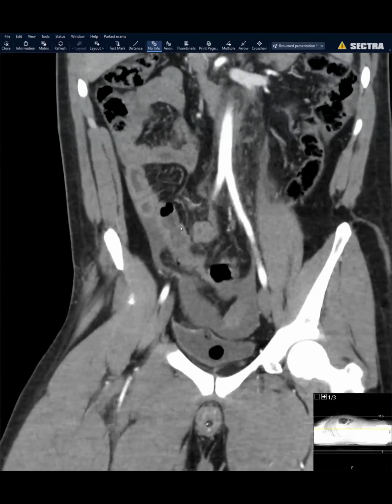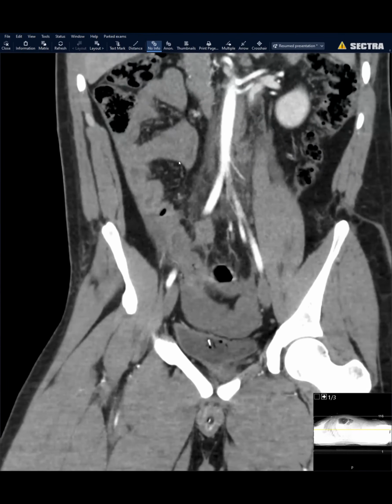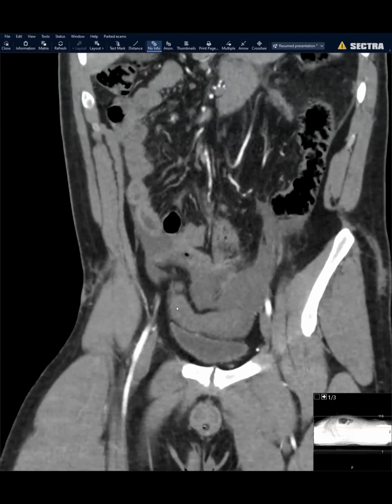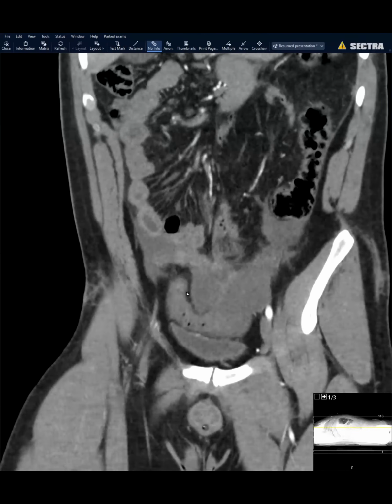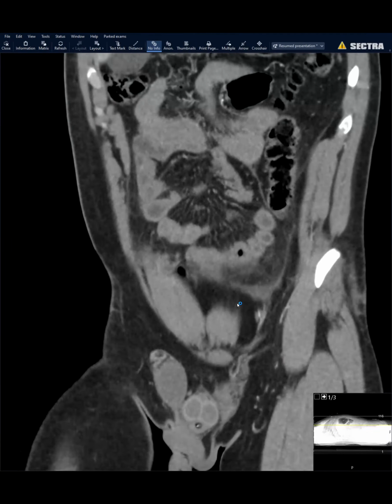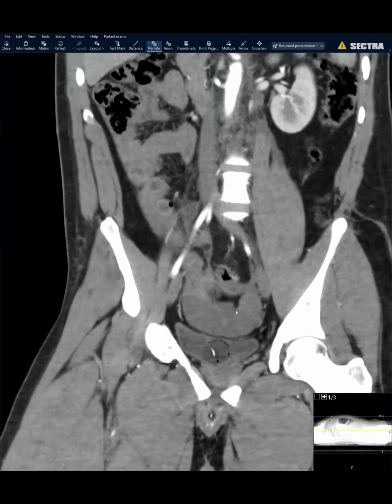This is again a nice case where the coronal plane actually helps you look for differential bowel enhancement. You can see here the right upper quadrant bowel is enhancing well, and you can see this loop, for example, here. This loop is clearly not enhancing, doesn't have a healthy enhancement at all in the pelvis compared to the loops that you're seeing up here. So sometimes the coronal plane helps you pick up differential enhancement because it allows you to compare different areas of bowel at the same time. So to answer your question, no, we don't use dual energy for trauma patients, but that's an interesting thought.